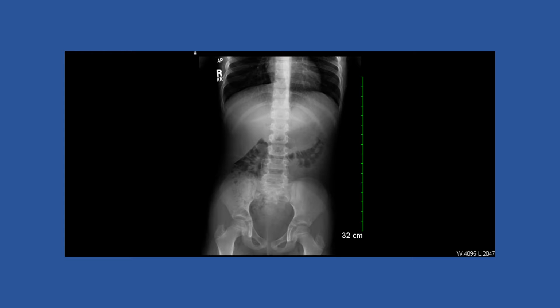It is not unusual to see this pattern in kids, especially 6-year-olds who have just gone off to school for the first time, just because they will hold their stool while in school, and then they kind of lose that sensitivity to the stretch of the rectum, and they end up with these large stool impactions. If they start soiling themselves in between, having some leakage, large stools that clog the toilet, then you start thinking encopresis.